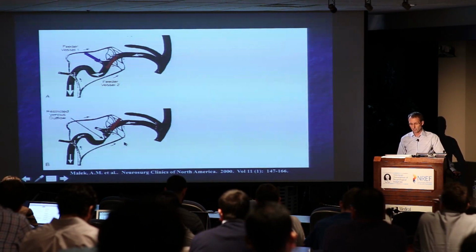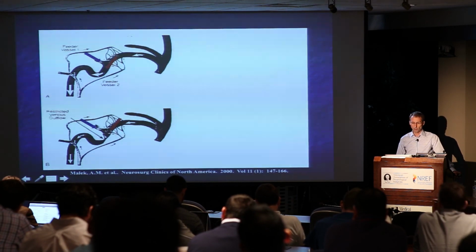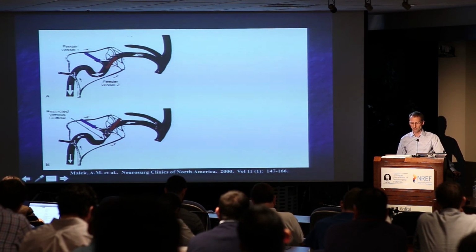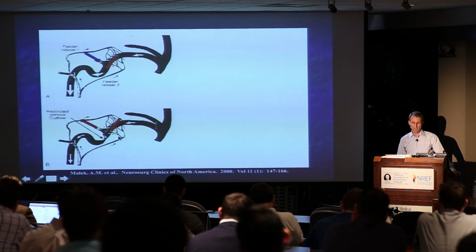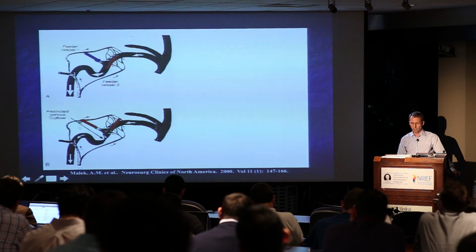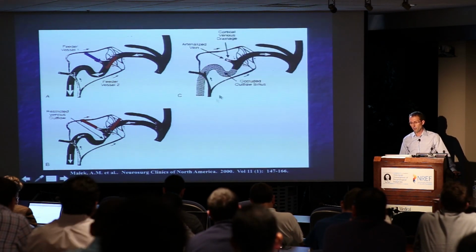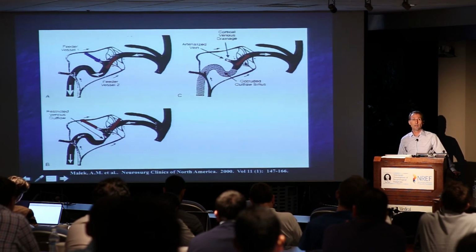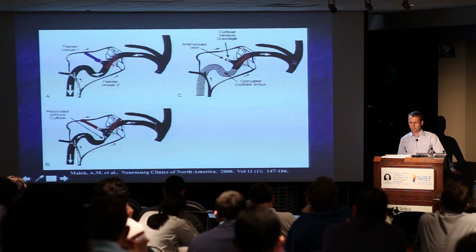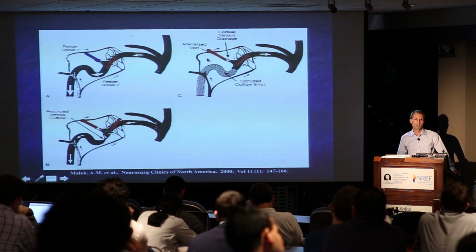And when that happens, it's going to start to restrict the arterialized outflow, and at some point, the normal inflow, say, of the vein of Labbé is going to become arterialized and may become retrograde in fashion. Okay? Well, you can imagine this continued to evolve where this will thrombose completely. And now you have an occluded distal segment of the outflow sinus, okay? And the arterialized blood, in this case, has no choice but to go retrograde out the, say, to the torcula and beyond, but again, most concerning in the arterialized vein.